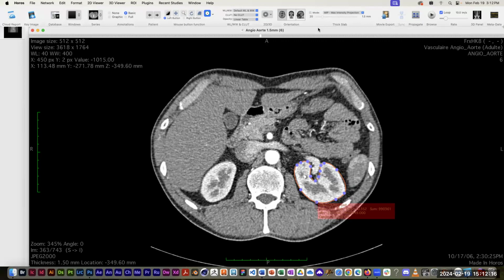Sorry, I gotta wait a second because the Zoom bar got in the way of my menu. Here we go.